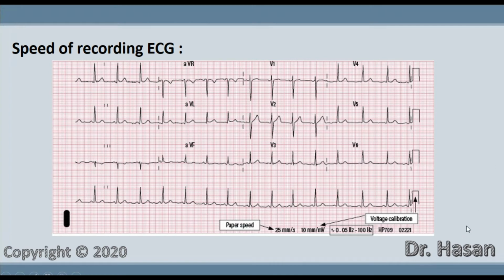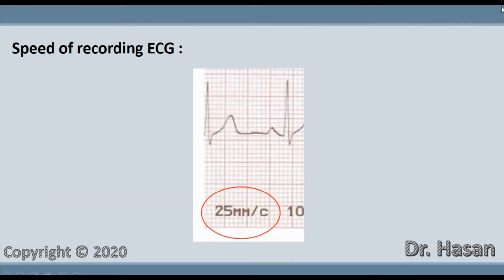The electrocardiograph automatically applies speed values to the tape. Usually, the speed is displayed at the bottom or at the top of the tape. Some devices do not apply speed values, but knowing the duration of the waves in normal and evaluating these waves on the ECG, you can understand how fast the ECG is recorded.